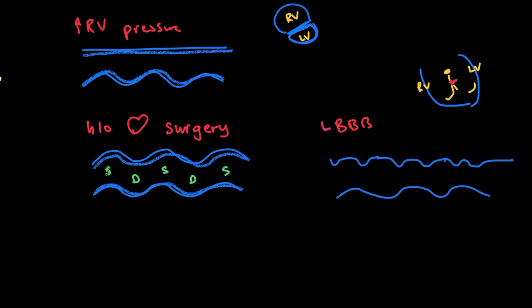That's this initial movement right here, early, and then the lateral wall catches up later. So there's not good synchronization between the two walls. You have your septum moving first, and then it stops, and then it kind of stutters and moves again in an uncoordinated manner.